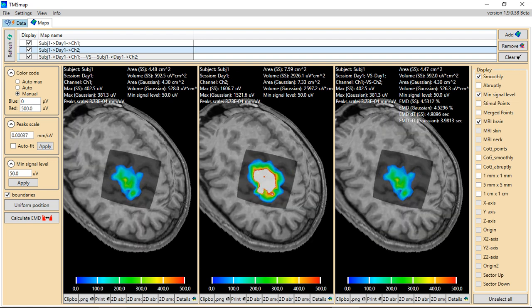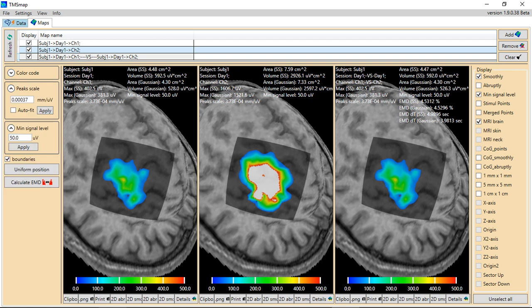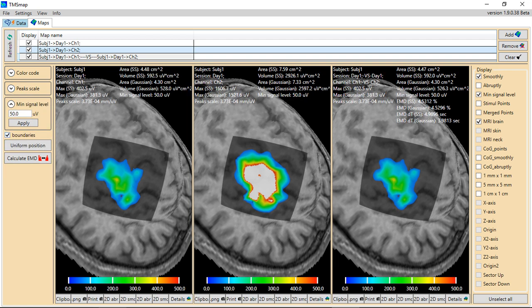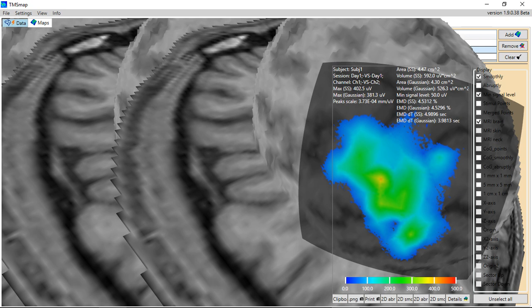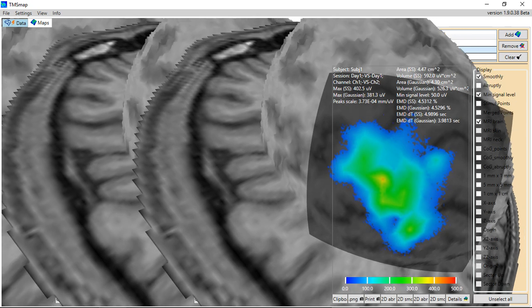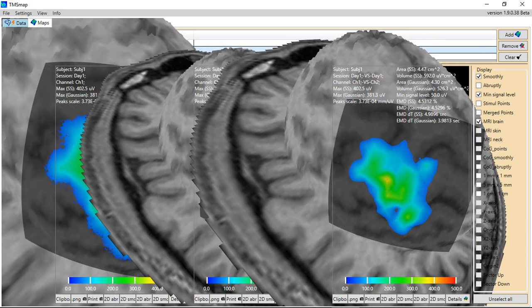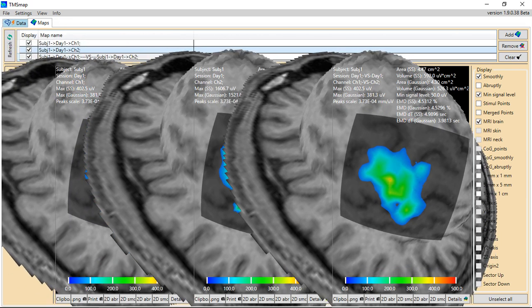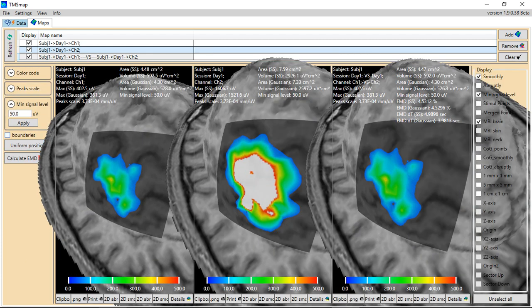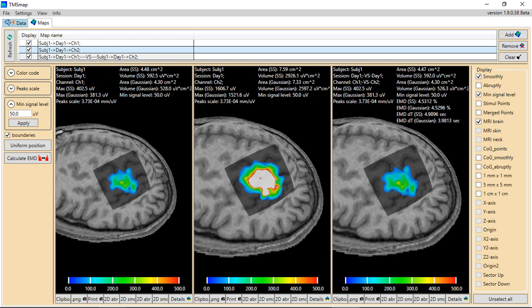You can zoom it. There is also the possibility to see these boundaries, so when you zoom it, you can unclick boundaries and you will see everything. But right now these areas are too big. I have to make them smaller. Now I have to click these boundaries. Okay, so you have all the characteristics of the map here.